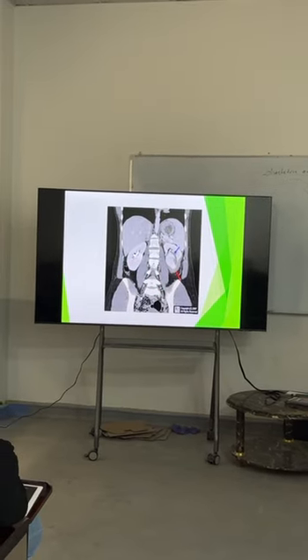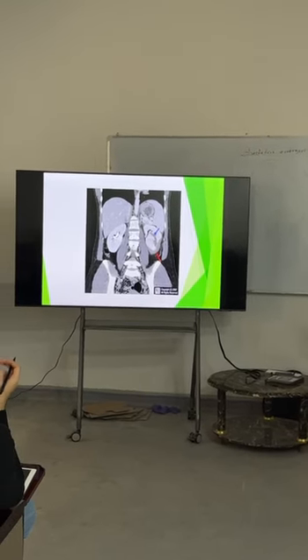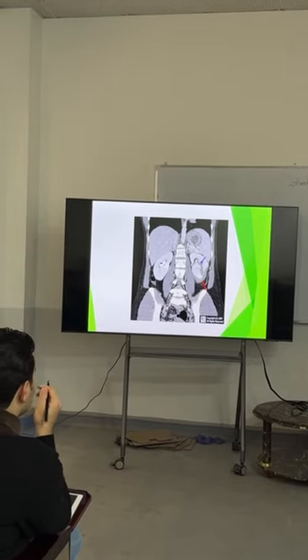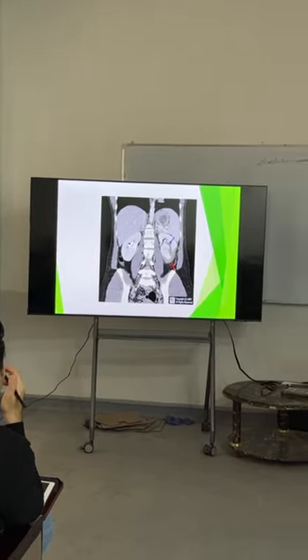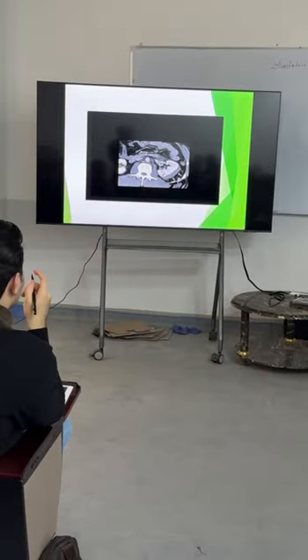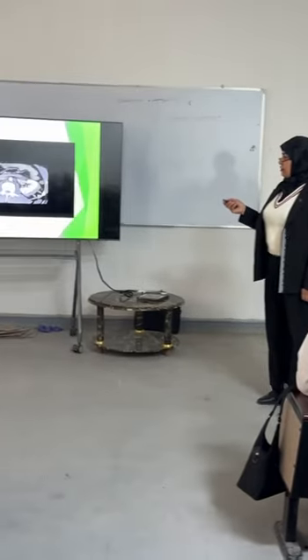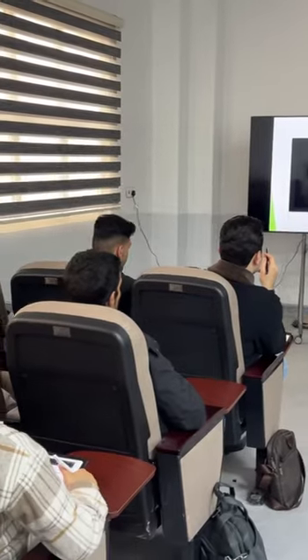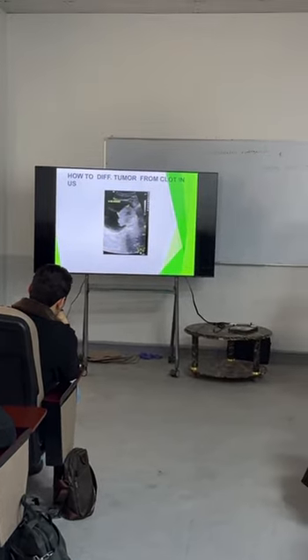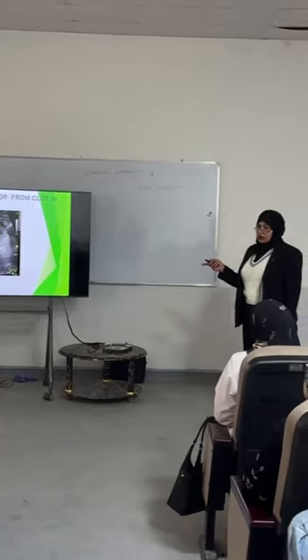This is which grade? Involves capsule, parenchyma, pyramid, and venous sinus, yes. Grade 4, excellent. This is which grade? Grade 3, excellent. Involving the capsule, parenchyma, and part of the pyramid. And now we move to ultrasound to show a tumor.